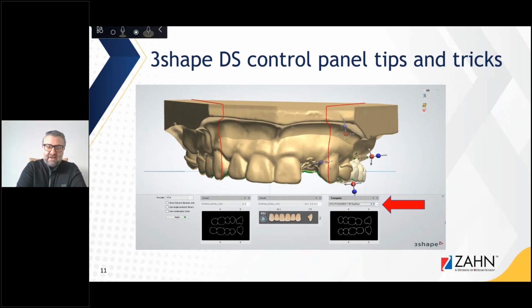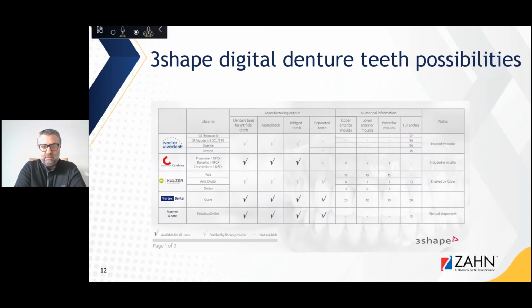Now, some of you might have the question, yes, but why do I need to activate this? Now, this is ideal for our today's presentation specific case, because what I did was with two different approaches, which we will discuss in about a couple of minutes. I always have the tendency to show this chart because this is really important, trying to understand what the capabilities of the teeth are. This will give you an idea of what you can do with different brands.